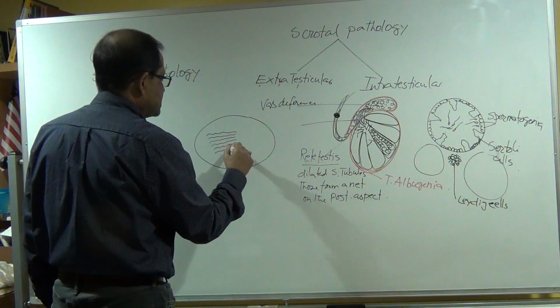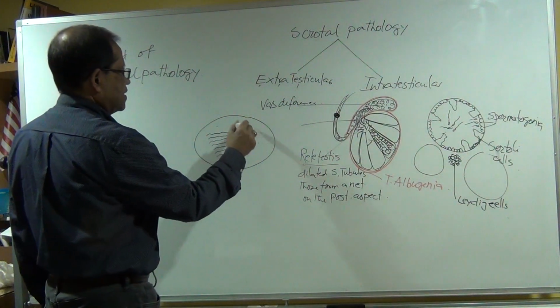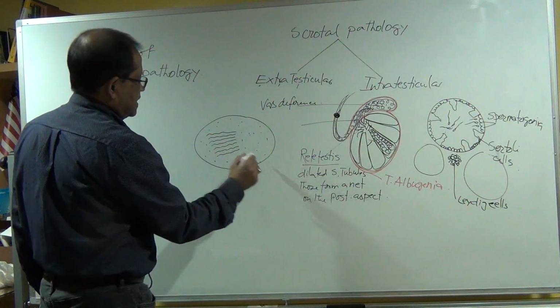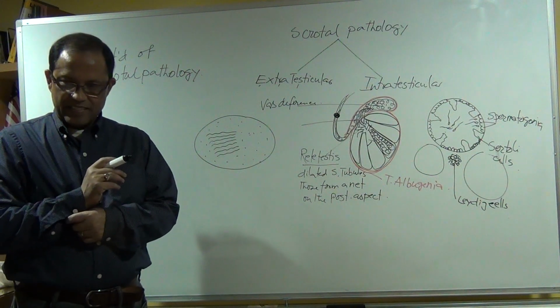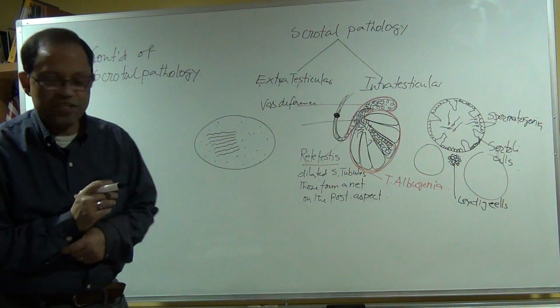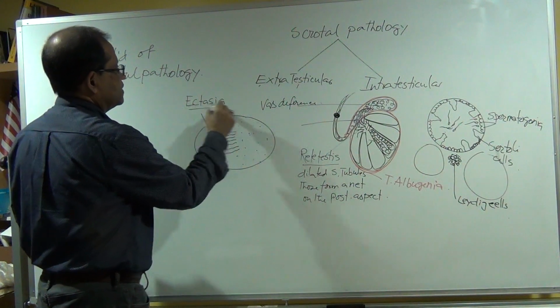Within the testis, there are dilated tubes. What is this? This is seminiferous tubules ectasia.